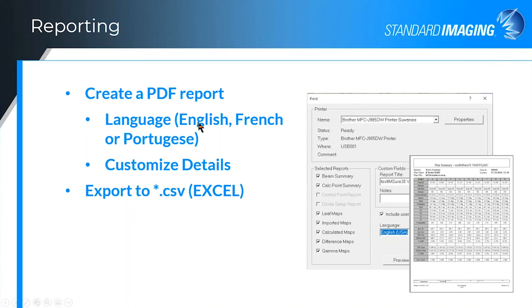We can create reports in English, French, or Portuguese. And as well, we can export the results to a CSV file so that you can import into Excel if so desired.